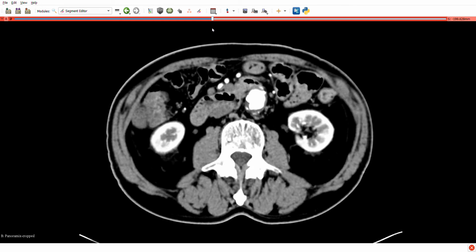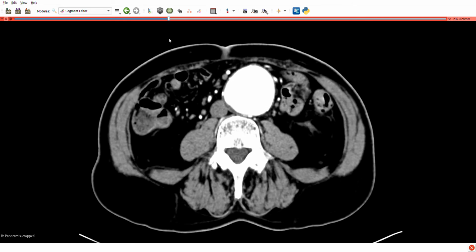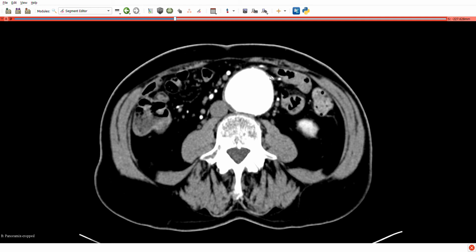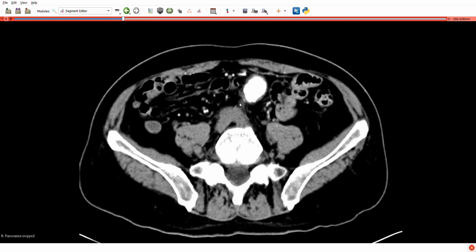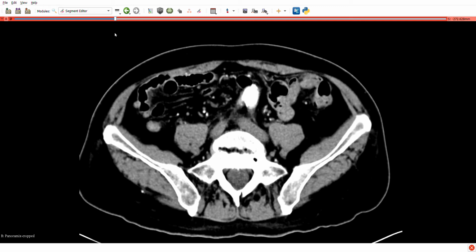The final branch we need to find is the inferior mesenteric artery. And the trouble here is that the inferior mesenteric artery in this patient is coming off of their dilated aorta at the level of the aneurysm. But I think we can just about see the inferior mesenteric artery coming off the aorta just about at this point here. So if we follow this little blob here, we should see it descending down on the left hand side and splitting into branches feeding the hindgut. So let's see if we can follow it down. And yes, you can see it there, splitting into these branches, feeding the hindgut structures. So there you go. There's the inferior mesenteric artery.